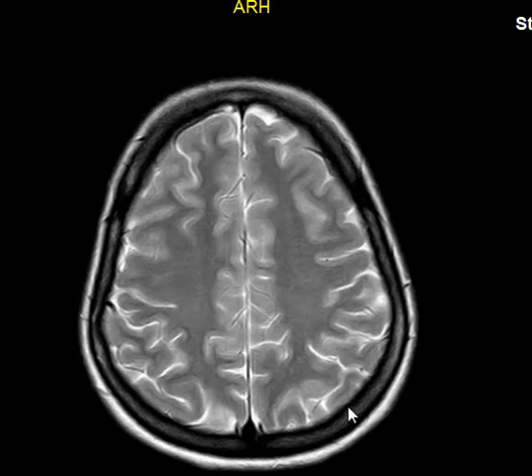If it is hematopoietic marrow, it does not contain fat. If it is fatty marrow, it contains fat. It differs depending on age. This is a young patient, about 20 years old, so more hematopoietic rather than fatty. With advancing age, it will change into fatty marrow.